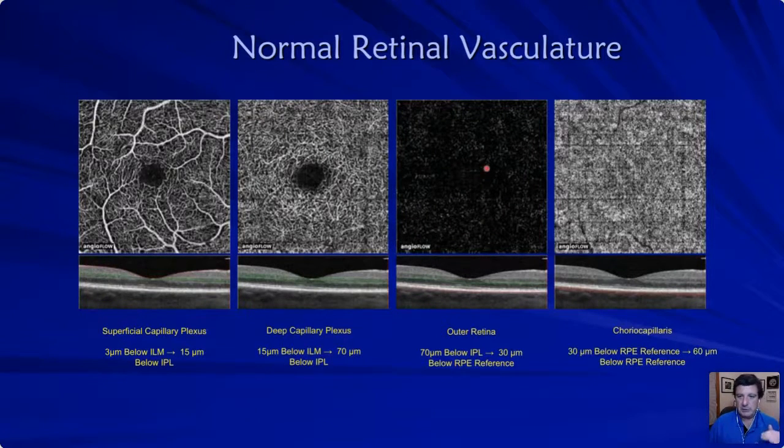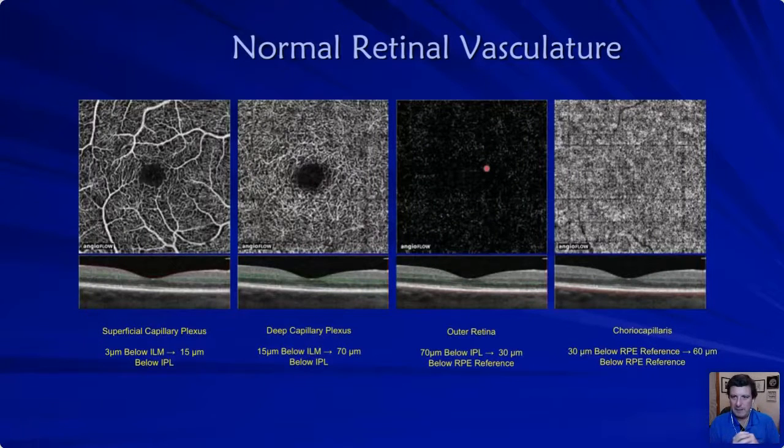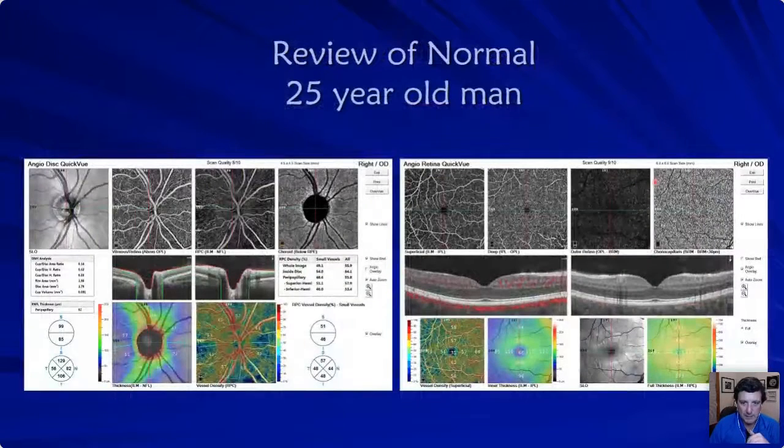Really, no blood vessels should be there, right? Those photoreceptors need to be clear to be able to capture that image and process that high acuity if they're in line and not being stressed. So no blood vessels out there. There's plenty of deep plexus to give them nourishment. And then you have the choriocapillaris. And this is all done because you're able to scan at 70,000 scans per second. I'll talk about that when we get there.